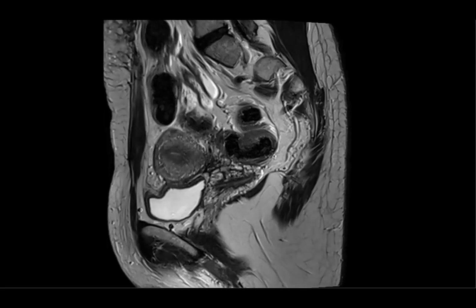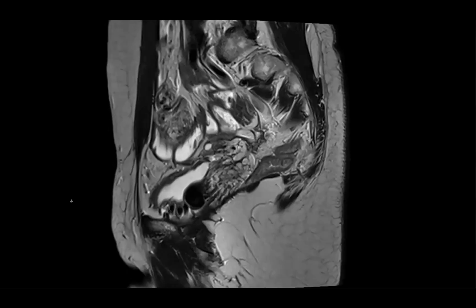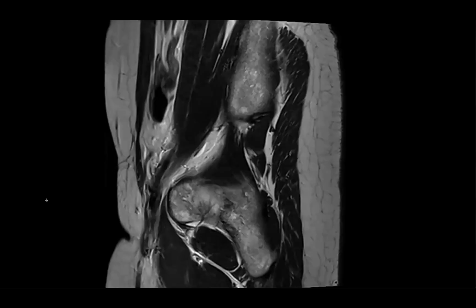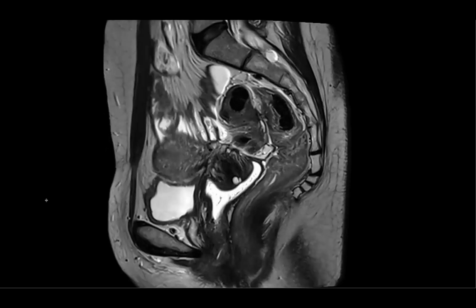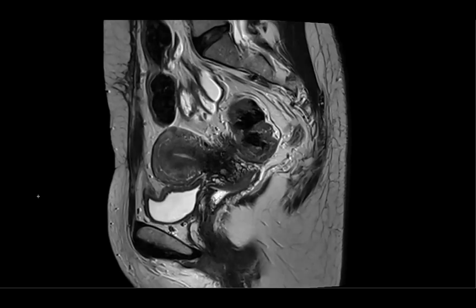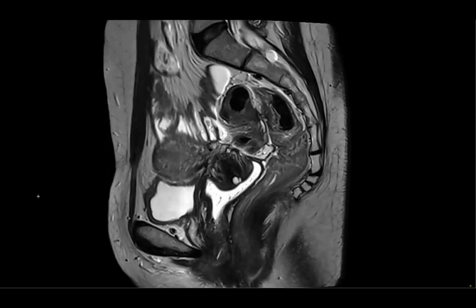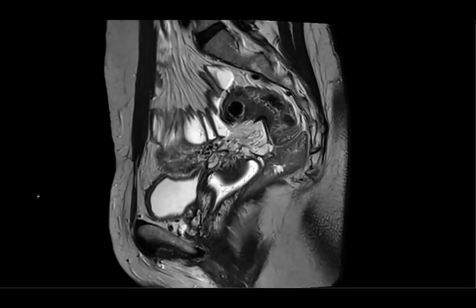Okay, so we have a phenomenal gynecologist here, and she's like a national expert in endometriosis. She gets MRIs for patients who are being evaluated in the endometriosis clinic, and this is one of the cases. So let me know what you guys want, and then what sequences you want. It's along the rectum anterior wall, right? Right there, mushroom sign. Oh, brilliant, brilliant.